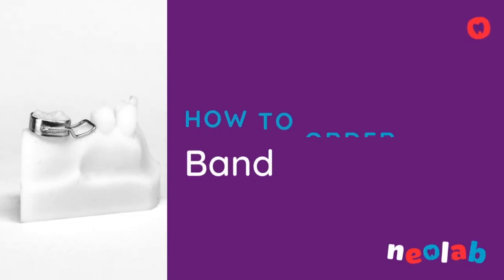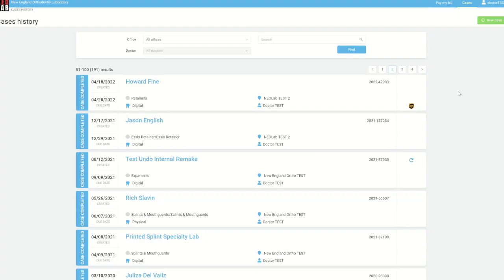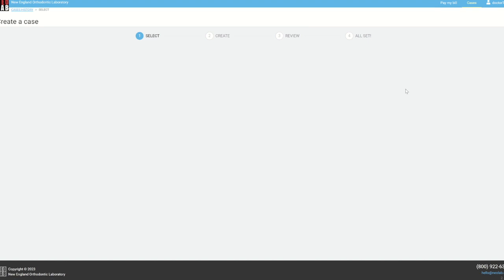Band and loops are a pediatric staple that holds space for erupting teeth. In this quick tutorial, we'll cover how to order a band and loop in RxWizard. After logging in, I will first click on New Case.